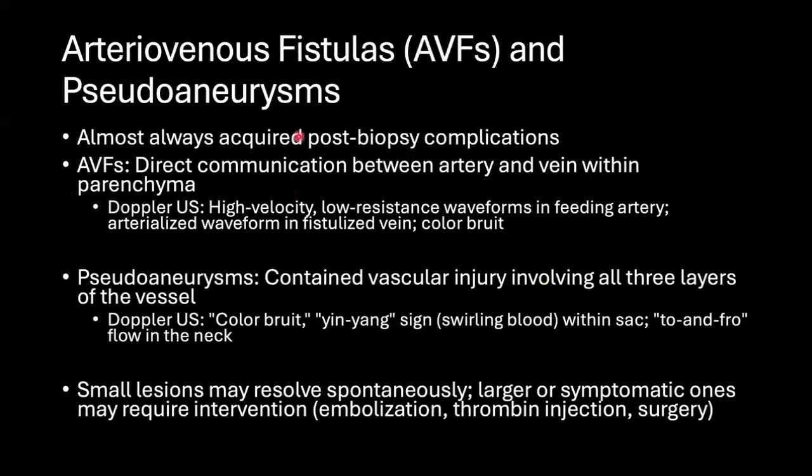Then last of the arterial or vascular complications, arteriovenous fistulas and pseudoaneurysms. They always or almost always occur post-biopsy. Unfortunately, they happen to both kidneys, native and transplant. Often in AVFs, there is direct communication between artery and vein. So you get a very high velocity, low resistance waveform in a feeding artery with an arterialized waveform in the fistulized vein.